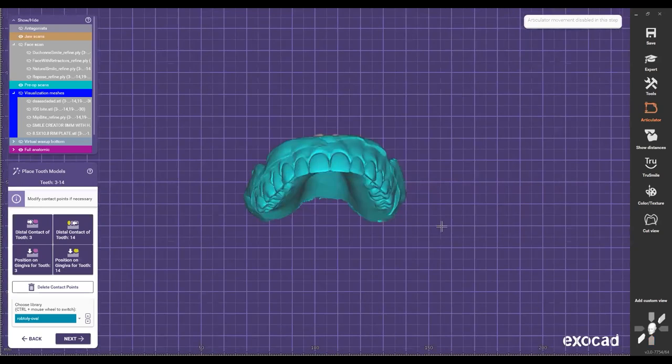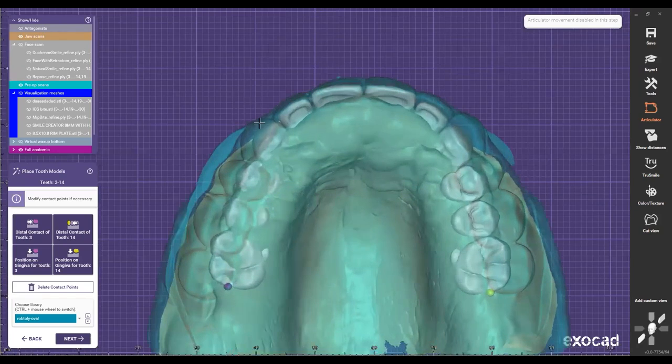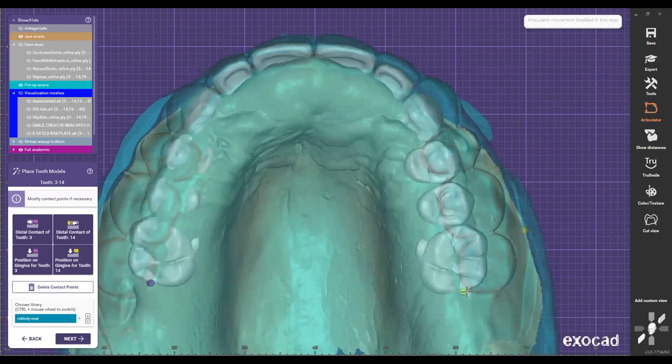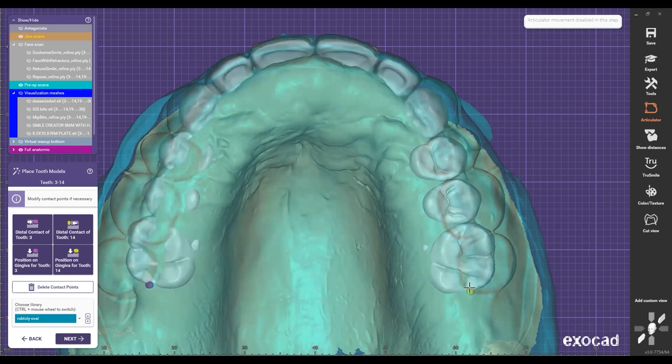So what I'm gonna do is I'm gonna go ahead and make this transparent, and then start moving this, and try to follow. See, from here, I can kind of tell if I like the height of that tooth. I'm just gonna try to preserve that right there, right? When I'm scaling it, all the teeth are gonna scale at the same time to the right dimensions, following the centrals. So I don't have to worry about scaling here and scaling here, because I don't want to change it. I want to keep everything the same. Plus I can see that 8 and 9 look pretty much like ideal width right here, and then ideal width right there, right?